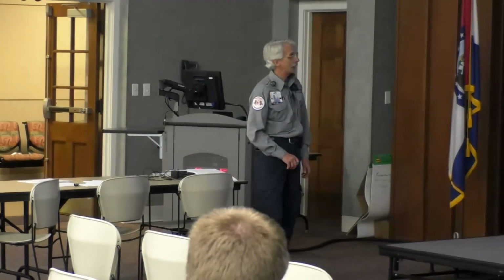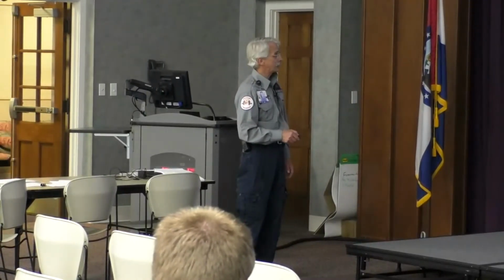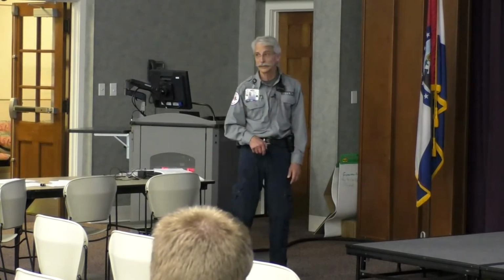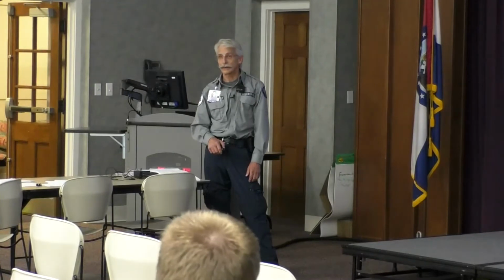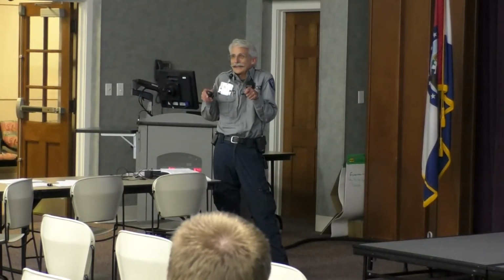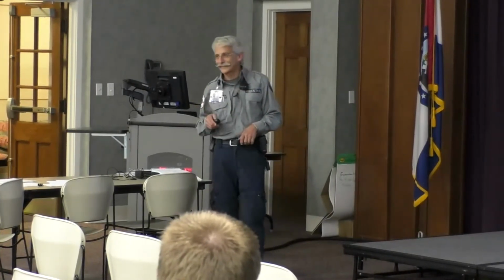So this one has an MI going on, or has elevation going on, in 2, 3, and AVF, and so we're going to call it a definite maybe on this patient. I know you don't have it right in front of you, so you can lay a piece of paper on it, and I get that. But that's what we're working with today.